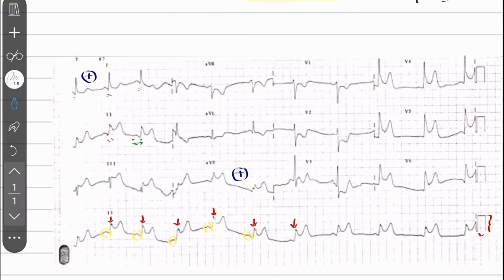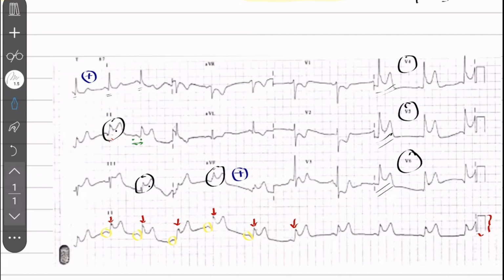The ST segment is not clearly elevated in lead 1, but it is starting. You could say that in lead 2, lead 3, and AVF, and you see it in V4, V5, and V6. You check this one. All these show elevation.